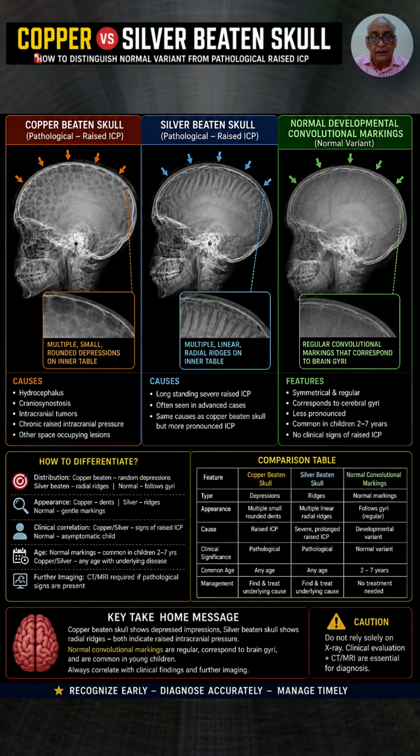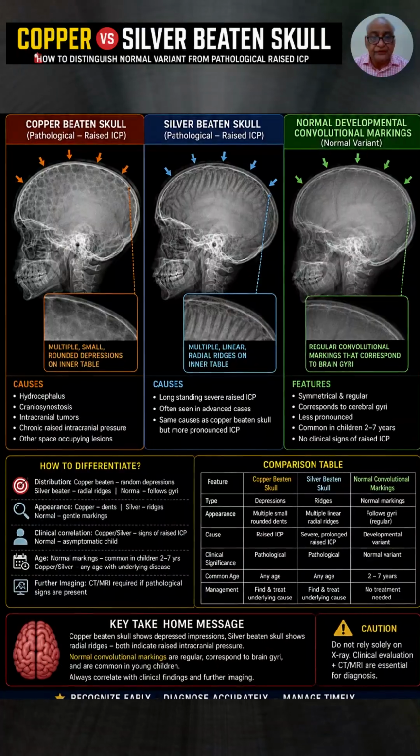Hello friends, take a close look at these three lateral skull x-rays. At first glance, they may appear similar, but their clinical significance is very different. Let's start with the image on the left.